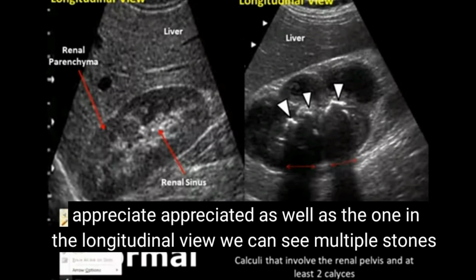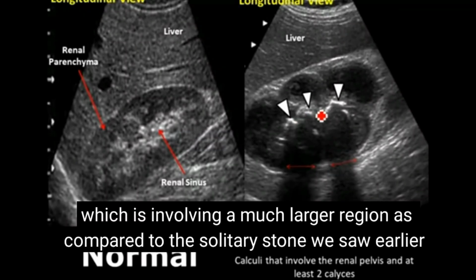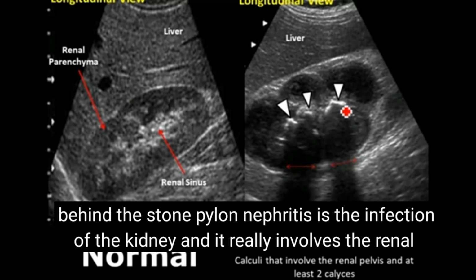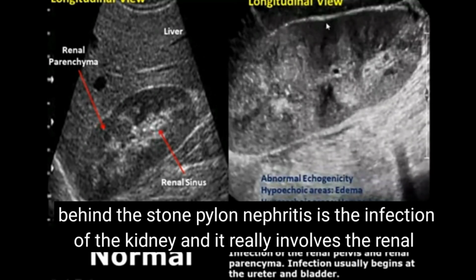In the longitudinal view, we can see multiple stones, which involve a much longer region as compared to the solitary stone we saw earlier, and we can see one acoustic shadowing here and another one acoustic shadowing here, behind the stone.